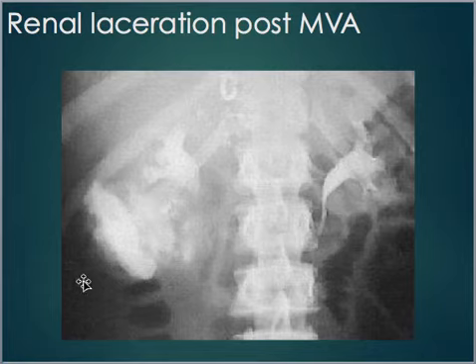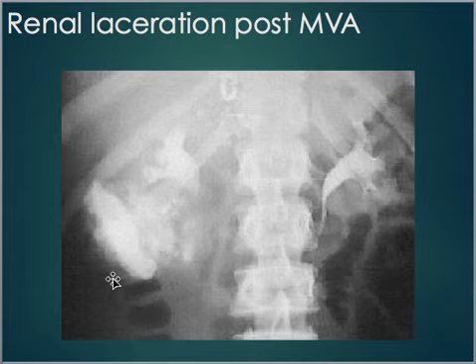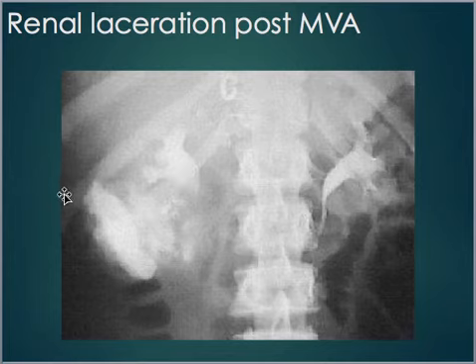So this is what I'm talking about when I said for some of the procedures, when we use barium, it would seep out into the abdominal cavity. With this, using the iodine, it's going to be okay because it'll be absorbed by the body.